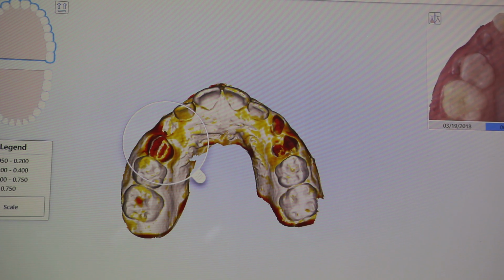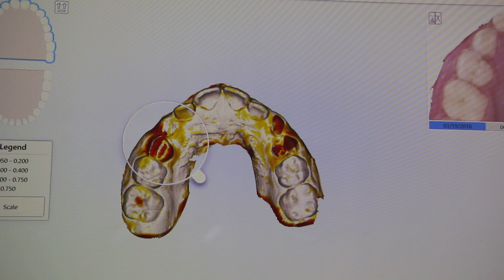But remember, anything that's changed is going to be in what color? Right. So all you need to do is put it over something red, and you see how it shows the change? So it's really a cool thing to do. And like I said, I use it in hygiene a lot for recession or abfractions, or if a cusp is wearing out or if something's been broken.